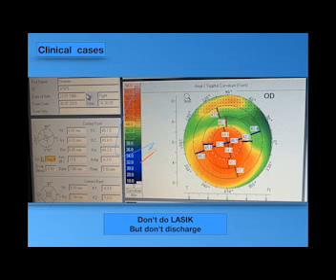Yes, I mean this. Okay, but this cornea could be with another problem than the conus. This is the differential diagnosis of that cornea. I just need to do brainstorming together for all the participants. Differential diagnosis of this cornea. This cornea is conus, or what else?